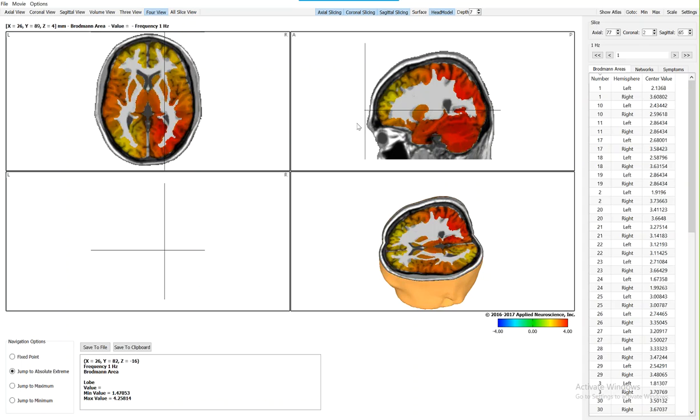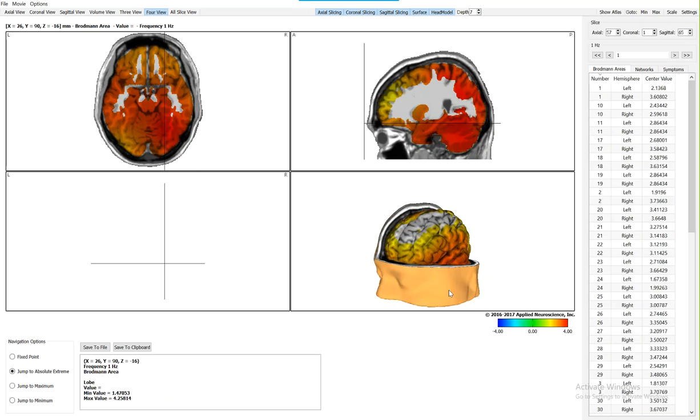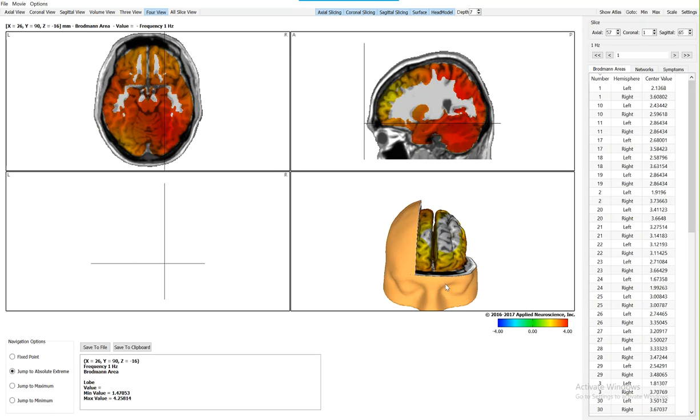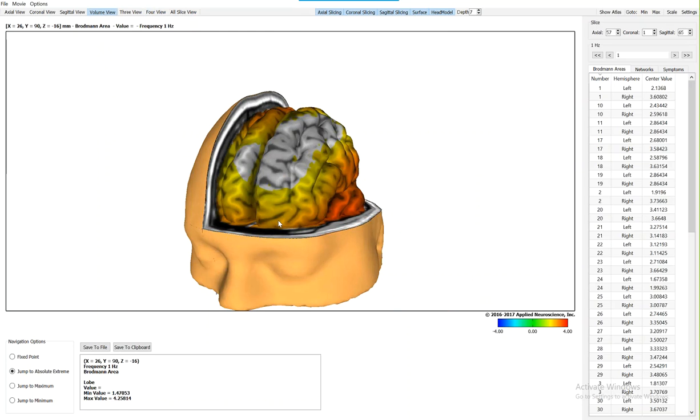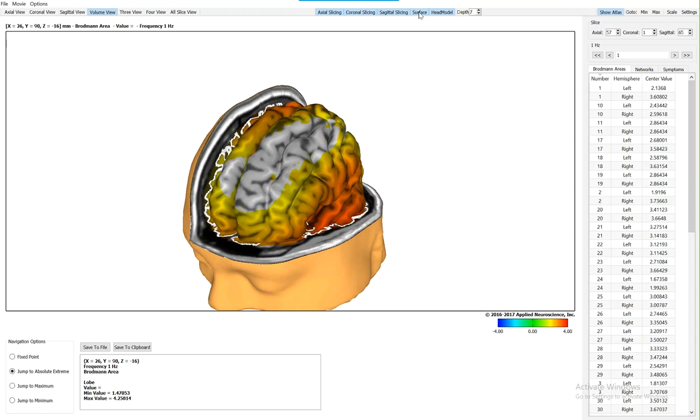There's the eyeballs, and then evaluate which regions of the brain are maximally deviant from normal, and then get a complete picture because we'll be able to relate the sources inside the brain to the electrical potentials at the scalp surface. So what we're doing now is just testing out these various views and trying to perfect them, and to make this entire process user-friendly.